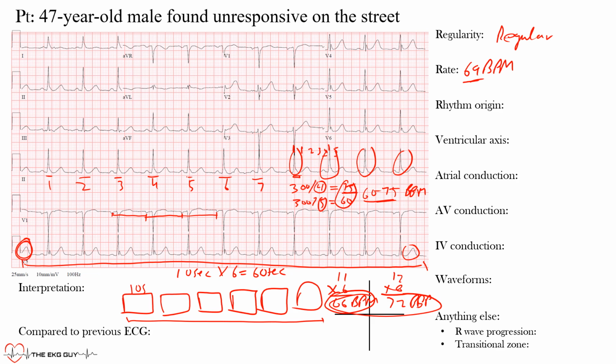If you wanted the atrial rate, you would use all these P waves here, all these P waves that are preceding the QRS complex and so forth. And in this case, you would get the same answer. That's helpful if we have an AV dissociation or we're trying to find what the underlying rate is of the atrial rhythm. Now, we said that the regularity makes a difference.